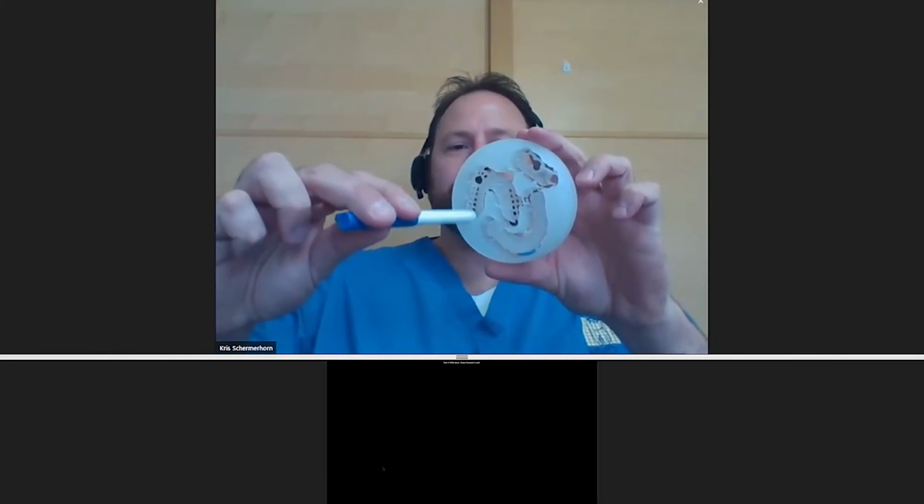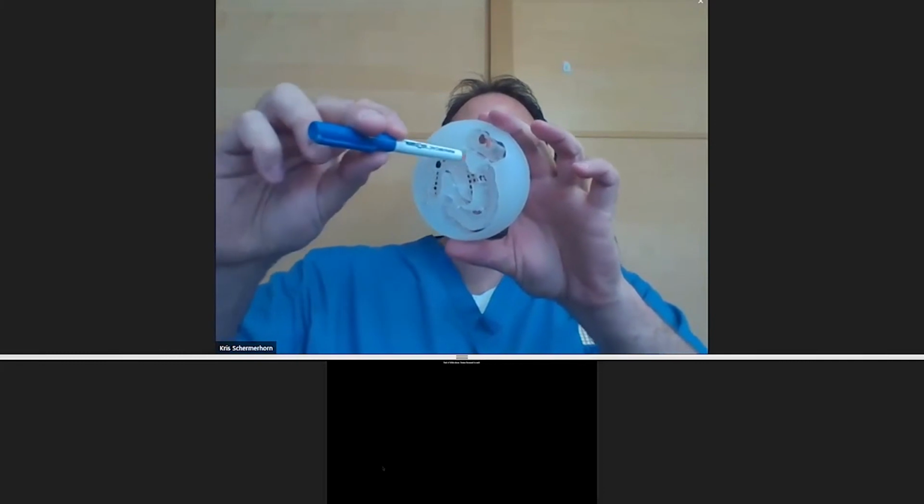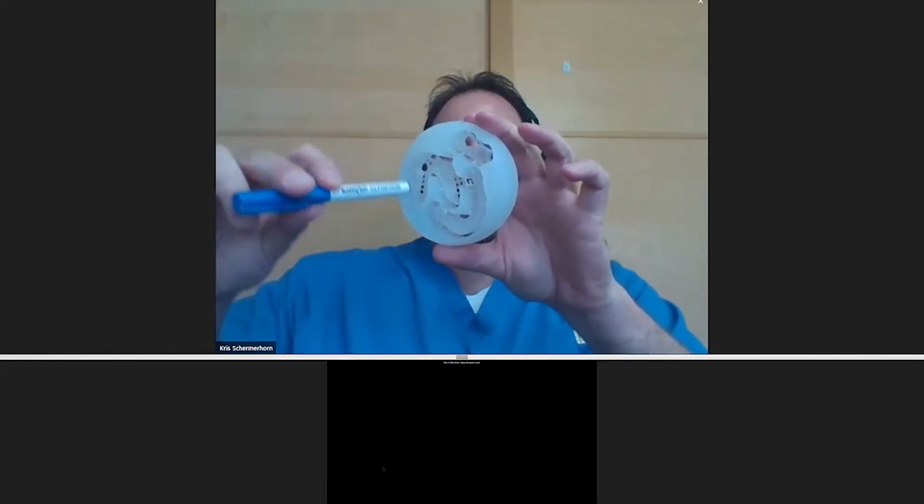And it is funny when you watch one of those mill out partials, it'll mill out a section at a time, and it'll sit there and mill zip, zip, zip, zip, and then it'll go on and mill zip, zip, zip, zip. It's almost like it's doing a full roundhouse bridge and it just slows it up. Whereas if you watch my mill, it'll come around and just follow that whole perimeter. And it just makes continuous closer swipes, and it's just much faster.